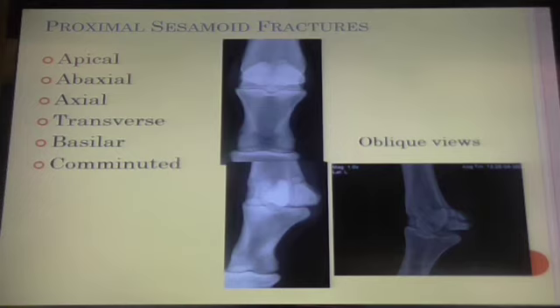You make some? Oh, okay. Are you asking what you were looking at? I want to know which sesamoid bone is fractured. That's a transverse fracture of the proximal sesamoid bone, right? It's a transverse fracture. Which one? If you have two, medial or lateral, which one?